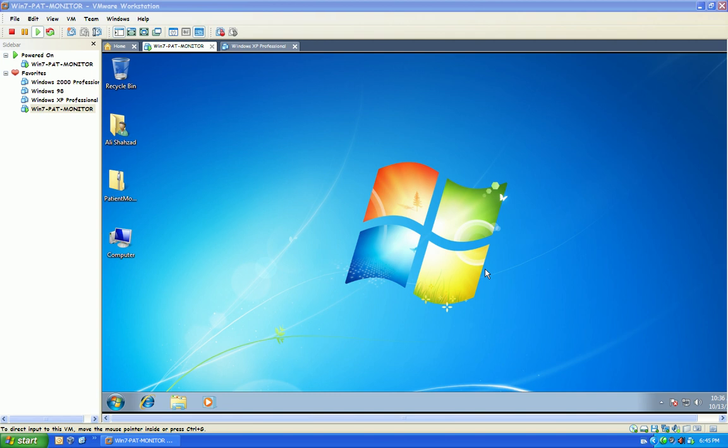My name is Alice, and today I'm going to show you a video about a patient monitor simulator.